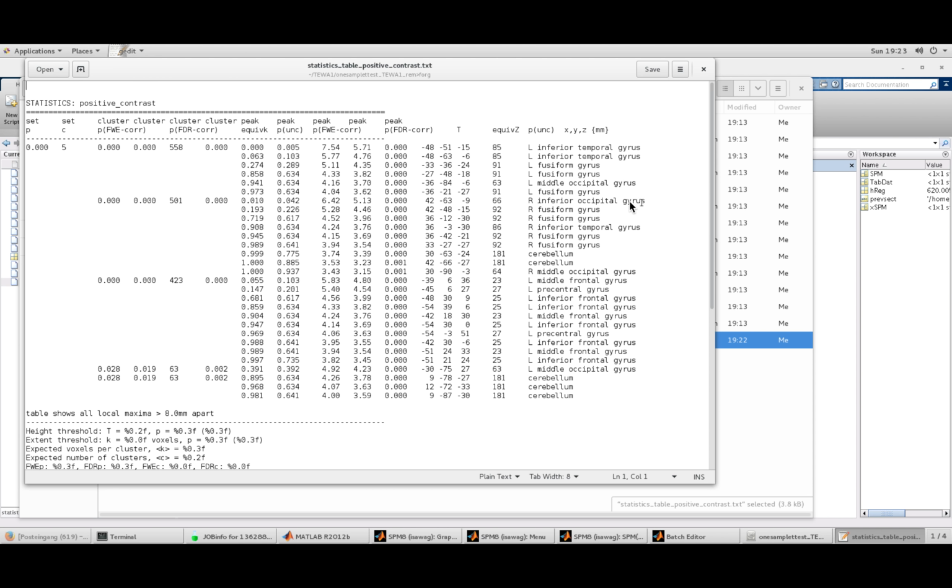In principle, you don't just look on the image what the regions are, because this atlas specifically only has gyri in it, so it always gives very specific names. For example, the medial prefrontal cortex, which is a very common region for memory, is also not in the atlas, and it will give you a different name, for example, medial frontal gyrus instead.